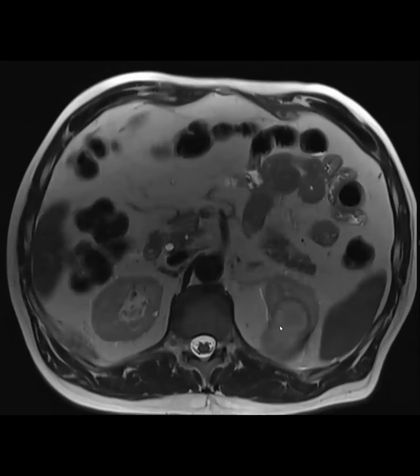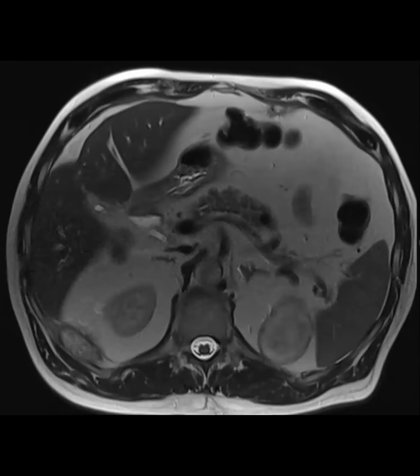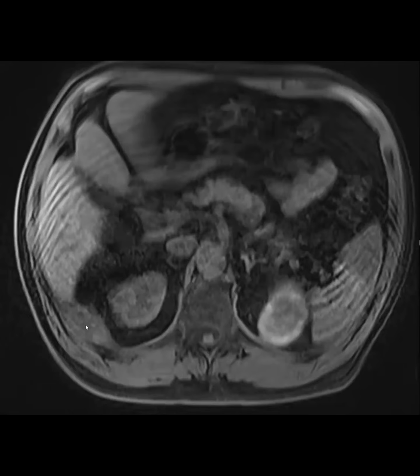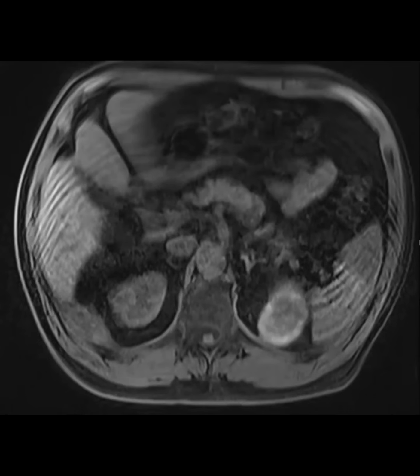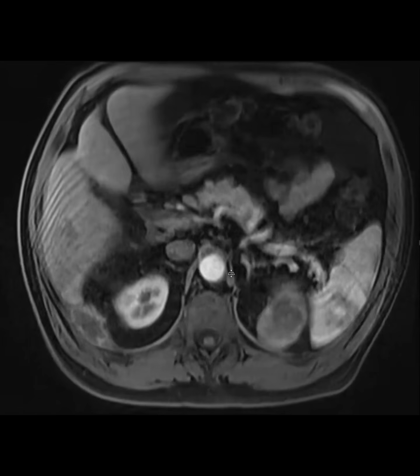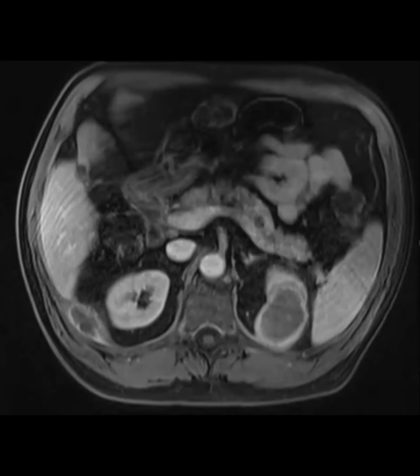Okay, so there's a weird renal lesion. Kind of ignore that for now. And then there's this thing on this side. Creepy. Wait, where is it? Is it in the posterior pleural space, below the diaphragm? Yeah, it could be very low in the posterior pleural space. Here's the arterial phase. Rim enhancing. Venous. Gallbladder? Where's the gallbladder? Gallbladder's gone.